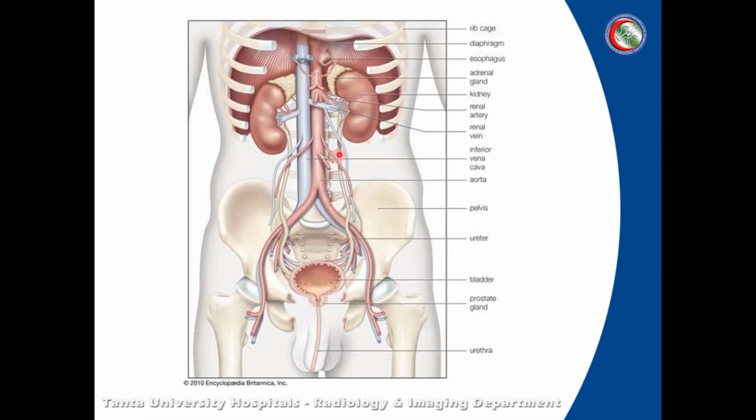The ureter descends downwards and is composed of three portions or three parts in its course. The upper third is opposite to the transverse processes of the lumbar vertebrae, the middle third is opposite to the sacroiliac joint, and the lower third is from after the sacroiliac joint to its end at the vesico-ureteric orifice, which is the pelvic portion of the ureter on both sides.